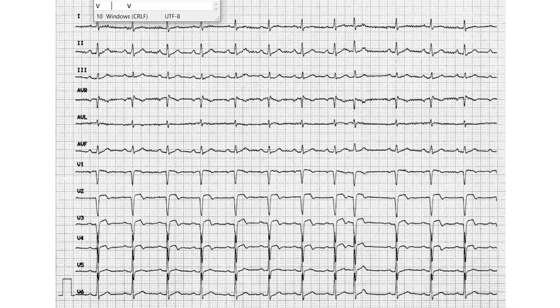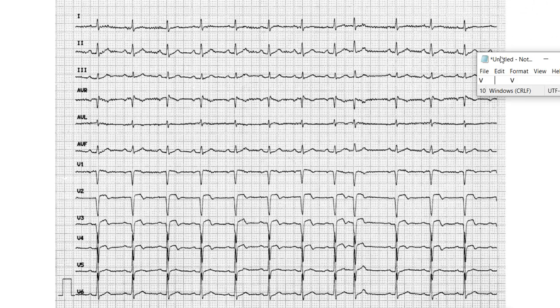So here, we start scanning with the sliding paper technique. And we start checking, and it still seems regular. Oh, but this might be an extrasystole because it's just extra. It's coming too early. So let's just ignore this beat. It's regular, and this is regular. So technically speaking, this looks quite regular, but with an extrasystole.